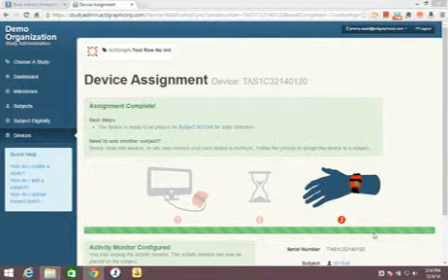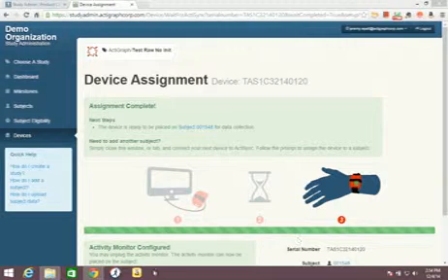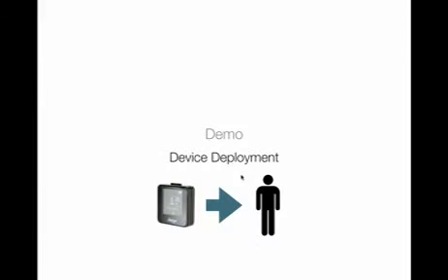And so contrast that to ActiLife, which requires many configuration options. And you can see the benefit of having that there and available and easy to do at each site. So that was a pretty straightforward demo.